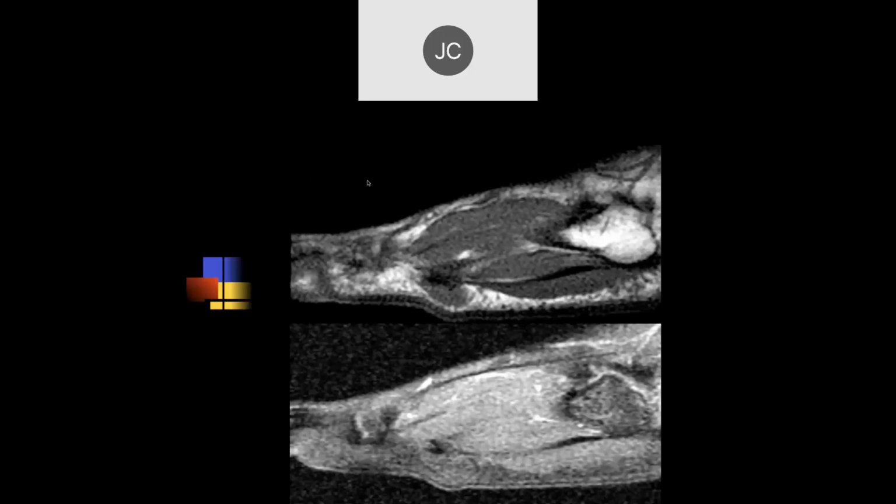Okay, so we're moving on to fibrous lesions of the soft tissues. So, Elior, what do you think is going on here? And this is what we're concerned about. Right, okay. On the plantar aspect of, is it the flexor tendon of the fifth digit? I don't have the flexor tendon here, but you're probably pretty close to the fifth metatarsal head here.